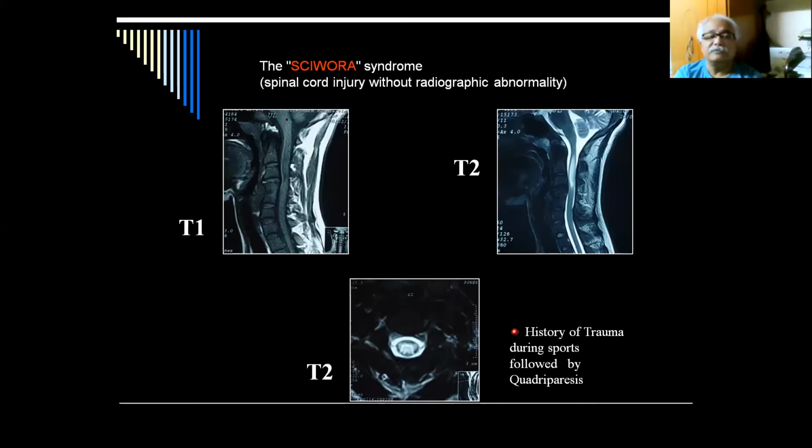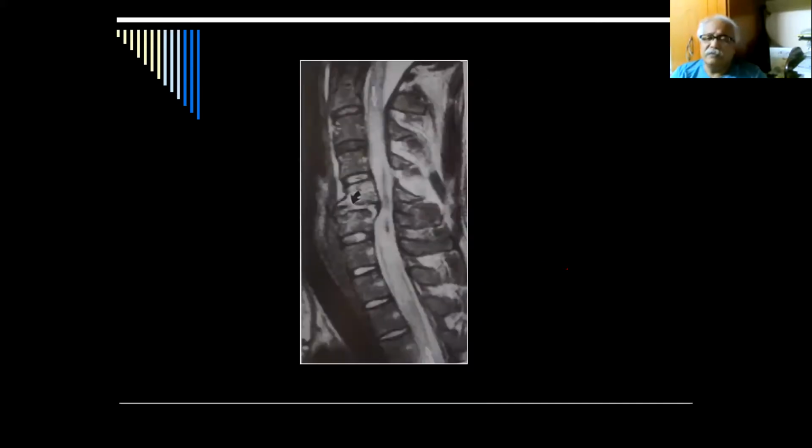Sometimes this sort of spinal cord shadow, this is a block vertebra, you can see, this is a block vertebra. And sometimes you can see in the spinal tissue or your neural matter, sometimes you can find this sort of shadow. This might be missed if you are not very meticulous in seeing what is happening in the neural tissue. You can miss this sort of shadow.